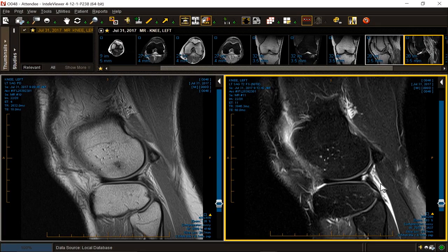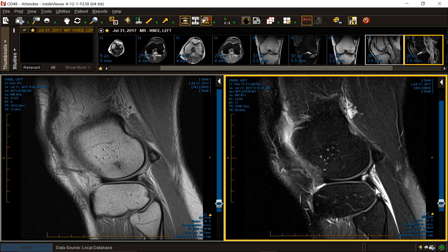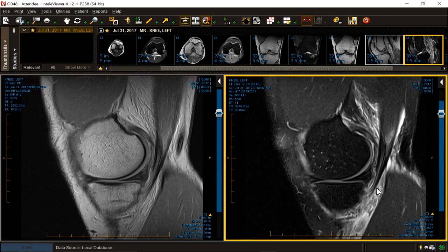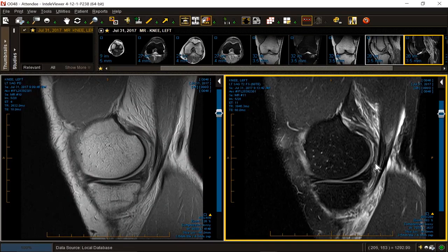The arcuate is a very thin, fibrillated structure, so it is one of the most prone structures to rotatory insult. So we have an arcuate tear, which means we have a low-grade posterolateral corner injury. We have a low to intermediate grade, actually an intermediate grade posteromedial corner injury that involves the posteromedial capsule. This is all capsular tissue.